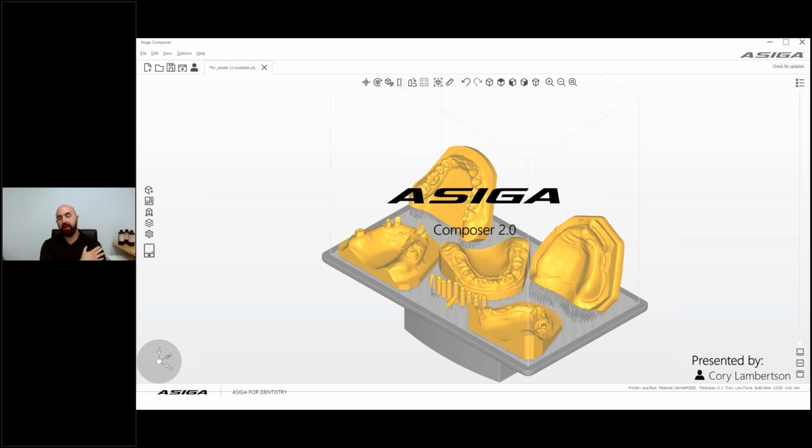Thanks, Fran. Hi, everybody. My name is Cory Lambertson. I'm the GM of Asiga Americas. And today we're going to be discussing Asiga Composer 2.0. For those that are not using the Asiga brand of products just yet, Composer is our nesting software. And it's been the same for quite some time.